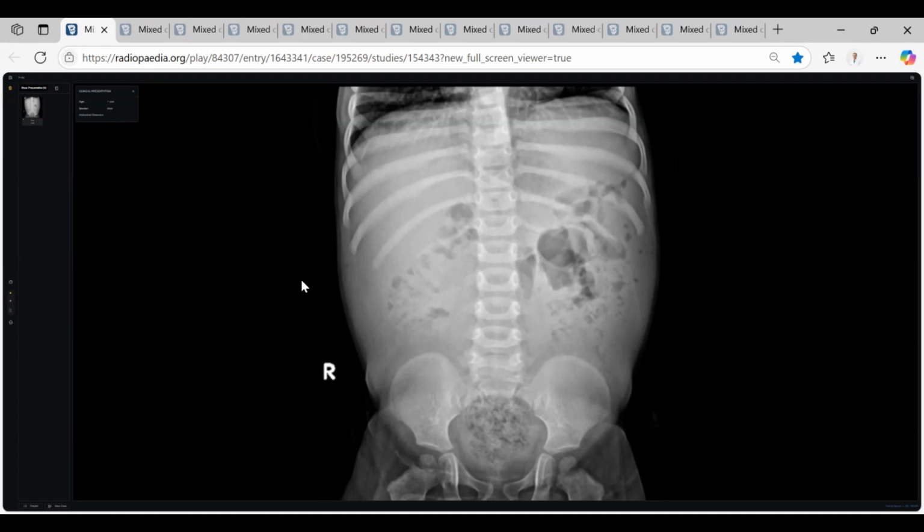Do you find any major abnormality here? I think the abdomen is distended, maybe ascitic fluid. No ascitic fluid, doctor. Okay. Do you find any other major abnormality here? Yes, this is the air in the bowel wall. No, the bowel is normal. Okay, what do you want to do next?